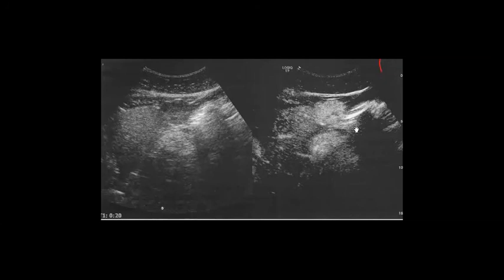Yes, this is the post-contrast image. The first image is non-contrast and the second image is post IV contrast. Exactly. So this takes contrast, is hyperechoic, and has a focal contour bulge, and it has something inside that is hypoechoic. I think you agree with me that we think about FNH as one of the good differentials. Nice, Muayyad. Nice, Ala.